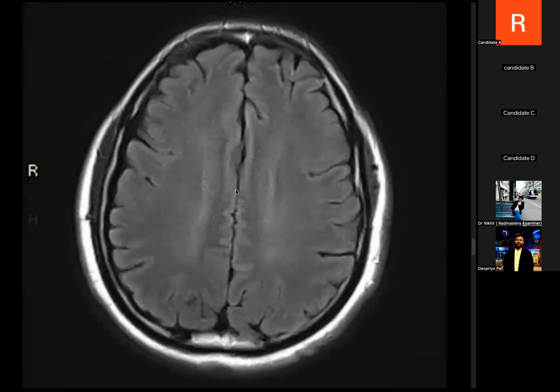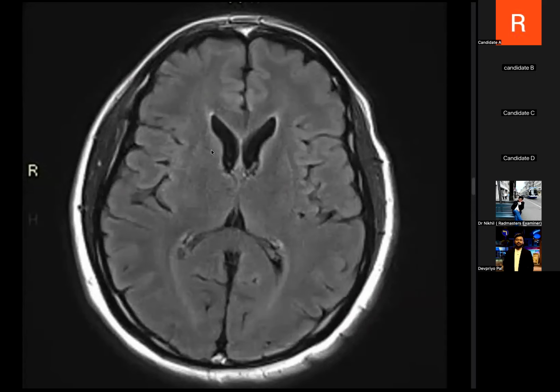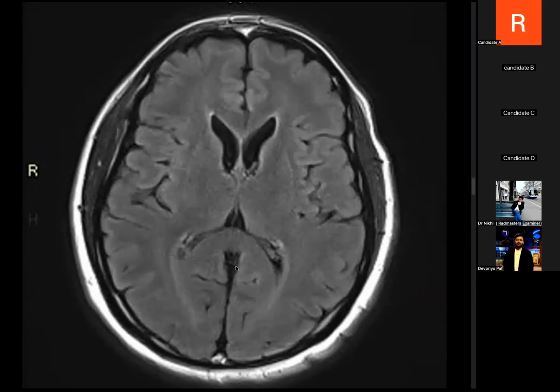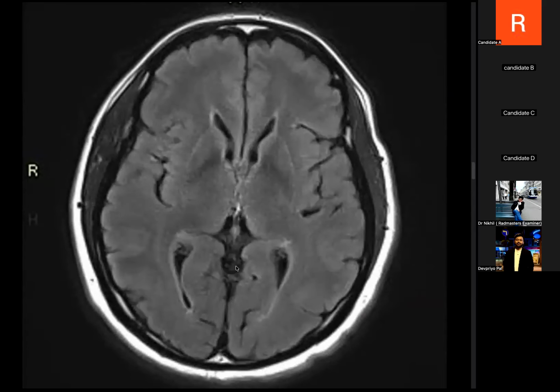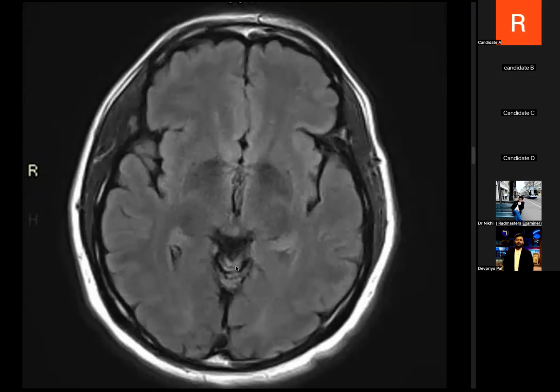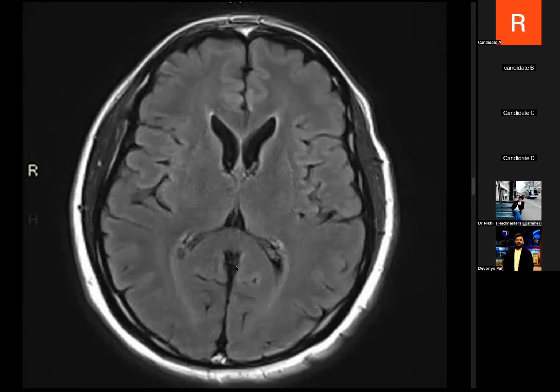And then when you come back to here, the caudate is literally absent. I mean, there is caudate atrophy in proportion compared to other structures, right? And putamen, not much, but yes, caudate is definitely atrophied in this case. So connecting the dots of caudate atrophy with hypometabolism on FDG PET, and seeing clinical manifestations, think about Huntington's chorea, right? Do you know what are the two measurements that we take in Huntington's chorea?